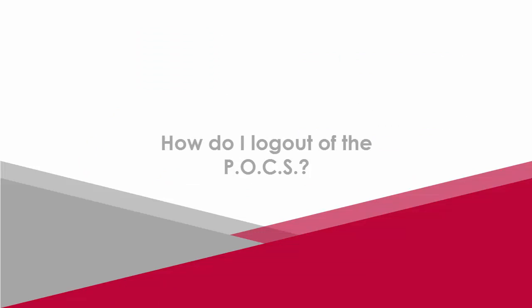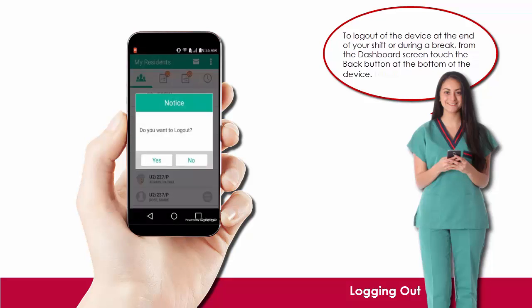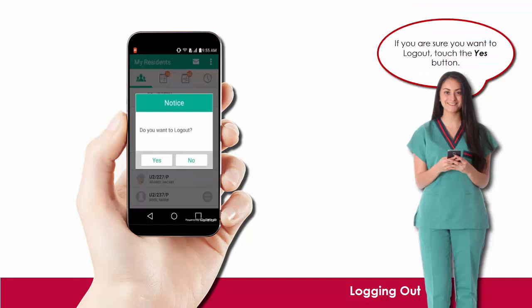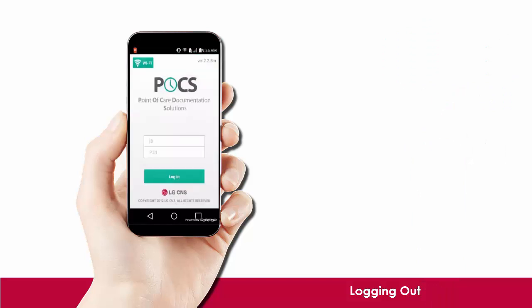How do I log out of the POCS? To log out of the device at the end of your shift or during a break, from the dashboard screen, touch the Back button at the bottom of the device. Note, if you are on any screen other than the dashboard, you may need to touch the Back button on the device multiple times until you see the notice, "Do you want to log out?" If you are sure you want to log out, touch the Yes button. You are now logged out, and the system returns to the login screen.